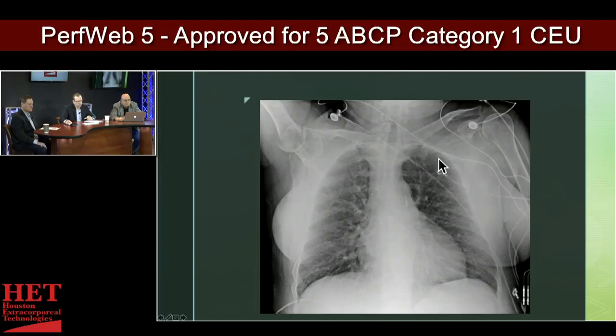And because you did a diligent job of moving all the lines and stuff out of the way, not to obscure your lung fields, you notice that you see this little thing right here. What do you think that is? Did someone leave a needle? That's a good question. I've seen that.